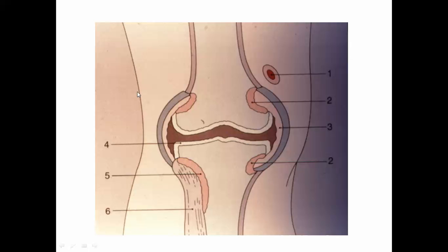So we can conclude that in rheumatoid arthritis we have the pannus mainly, which erodes into the joint margins, especially at the capsular margins, capsular insertions. Number 2 is the synovial thickening. Number 3, the presence of articular surface erosions, skin nodules, and periarticular soft tissue swelling.